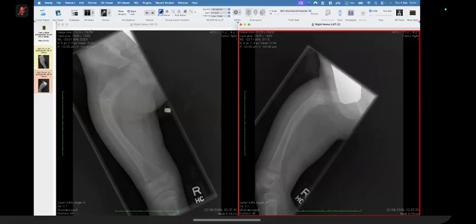I cannot appreciate any epiphyseal changes. So yes, osteogenesis imperfecta. I cannot appreciate any background abnormality within the medullary region to give a diagnosis of any pathological fracture.